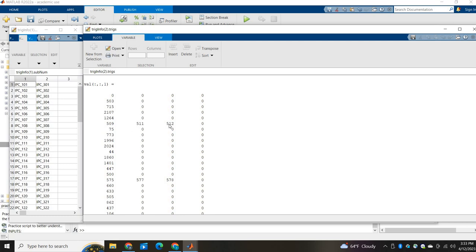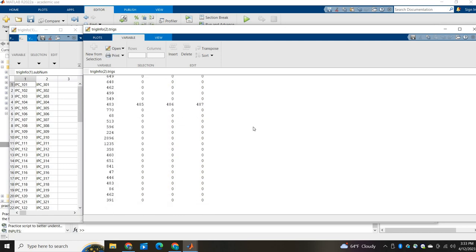And that's not great for pre-processing, because when I pre-process I go, oh, just choose the first trigger or the last trigger, but maybe for this one I want the middle trigger, you know? I mean, realistically for this I want just the last trigger. But yeah, you can notate, you're like, okay, some of these have more triggers than I wanted, and that's not good. I need to change that. So what you can do is just take note of which ones you want to change. Specifically, I know that I want to change this one because, as you can tell, there's a trigger for some reason really late in the game. So what I want to do is change it so that I no longer have this one.